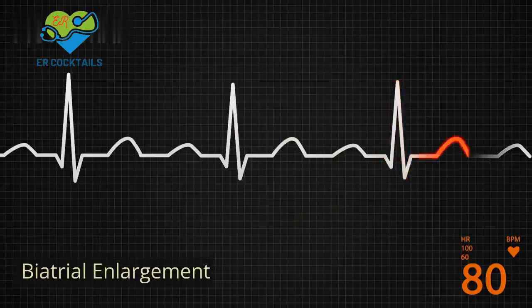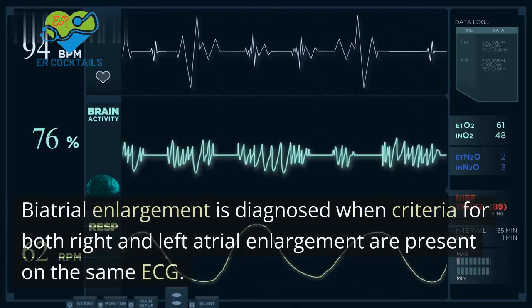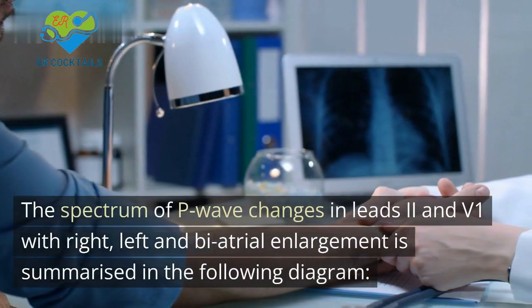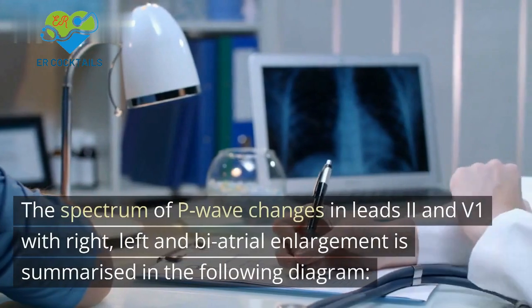Biatrial enlargement. Biatrial enlargement is diagnosed when criteria for both right and left atrial enlargement are present on the same ECG. The spectrum of P wave changes in leads 2 and V1 with right, left and biatrial enlargement is summarized in the following diagram.